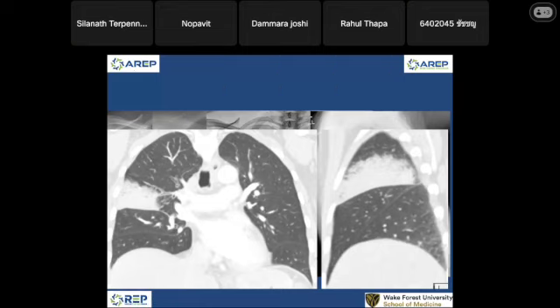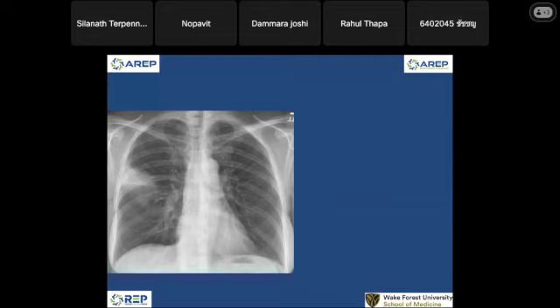If I were to read this case, and suppose this is a 25-year-old person, his bones don't look so bad, so he's young. So I will say, okay, I'm thinking this is right upper lobe pneumonia, and I will stop. I just say, go back, treat the patient with antibiotics. If the symptoms are getting better, you do nothing else. Done. If the symptoms are still there after you expect the patient to get better, or the patient is getting worse during the symptoms, come back and do CT.